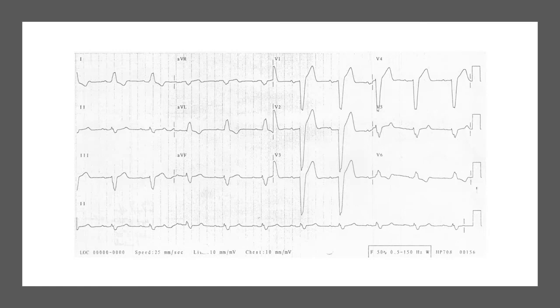Okay, so this is a somewhat ugly looking ECG. You can focus in on V1 and V6. And again, pause the video for a second if you're wanting to try to guess on your own. You have a wide QRS. You have a deep S wave with an upright T in V1. You have an upright QRS complex in V6 with a little bit of a notching pattern and a flipped T. This is your classic left bundle branch block pattern.